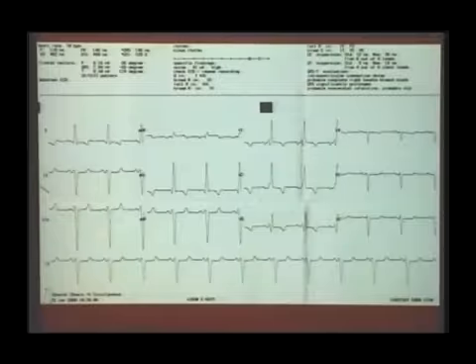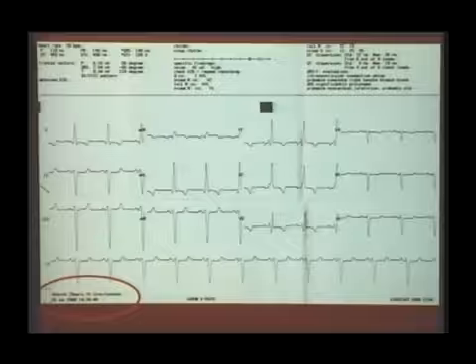When it is abnormal, how it is normal. So, any ECG recording like this, you must see that at the bottom you would have this vertical bar saying 1 millivolt standardization, or 10 millimeters per millivolt, and the speed of recording is 25 millimeters per second. Without making sure of this, you are not supposed to interpret and diagnose ventricular enlargements, bundle branch blocks, duration and so on.